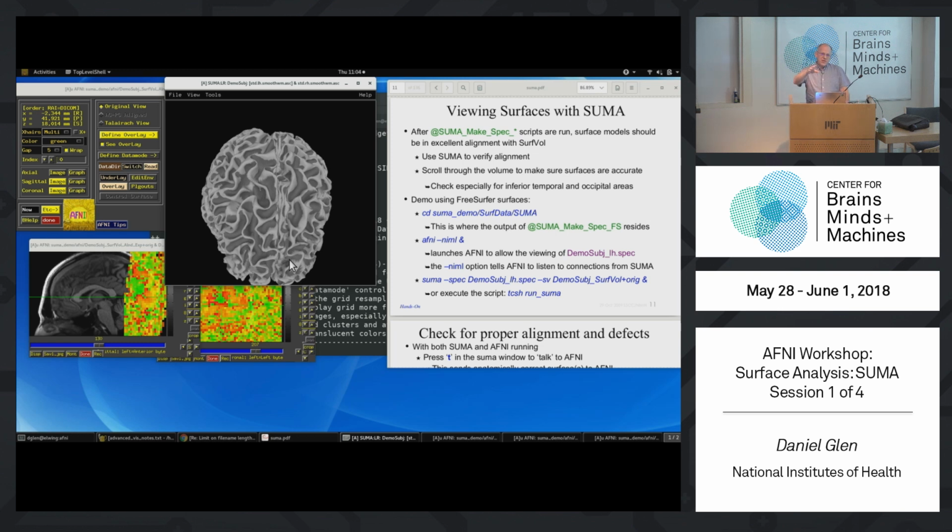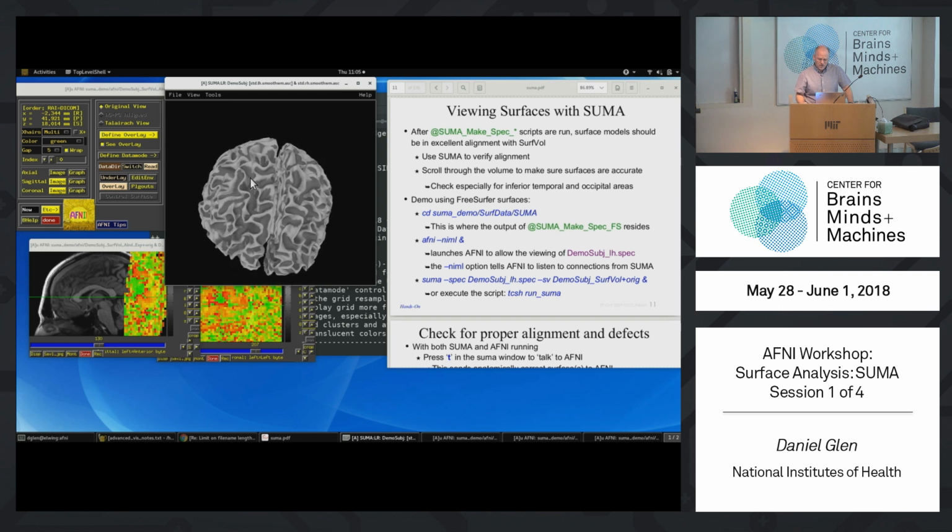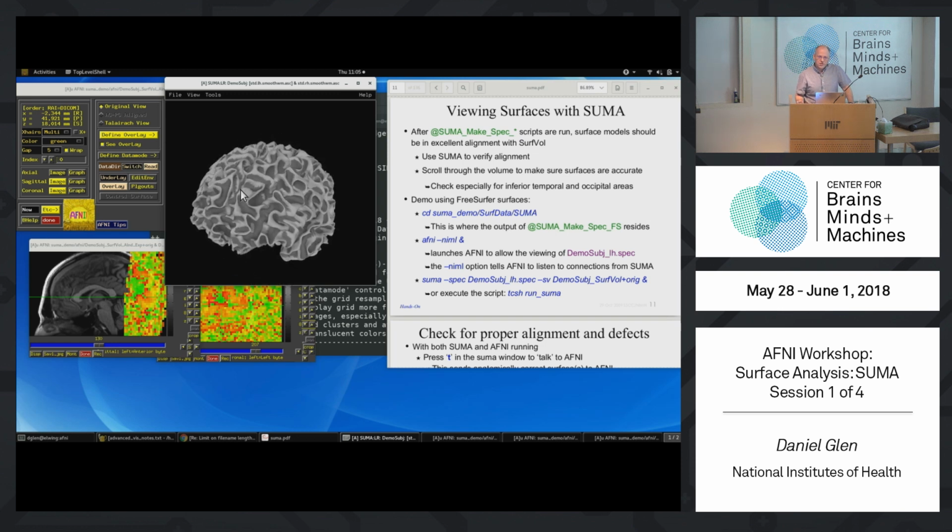Now, if you're running a Windows laptop, sometimes the OpenGL that this uses is not as pretty as others, but it will generally work. It might be a little bit flickery, but it will work. I think Windows needs to improve the OpenGL performance on their Linux subsystem, but I found that mostly it will get to where we need to get to.